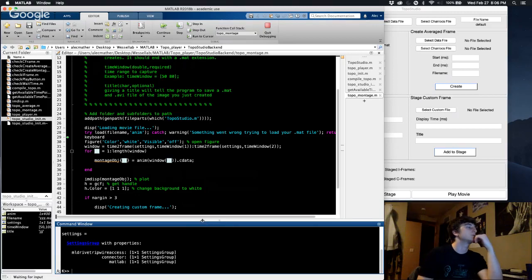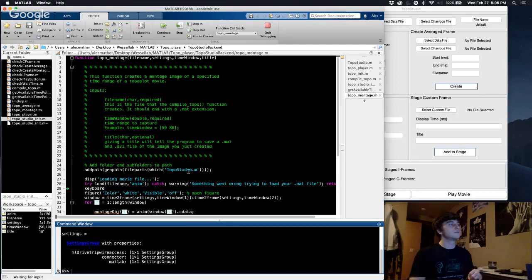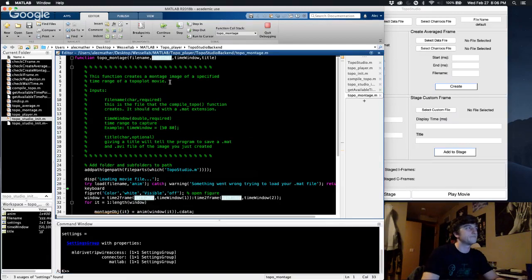Oh, dang it. We have to call this my settings. Actually.